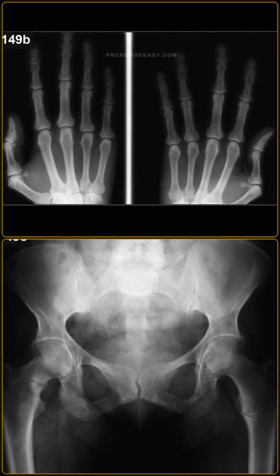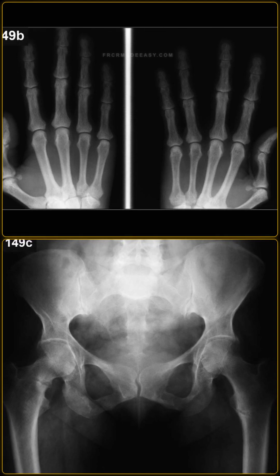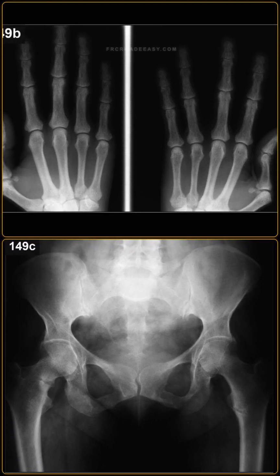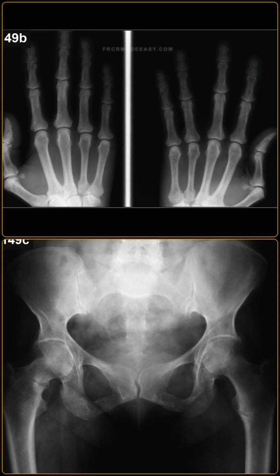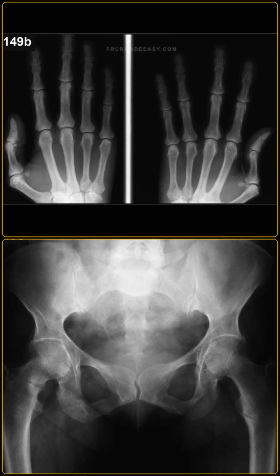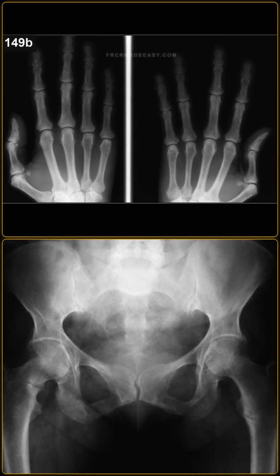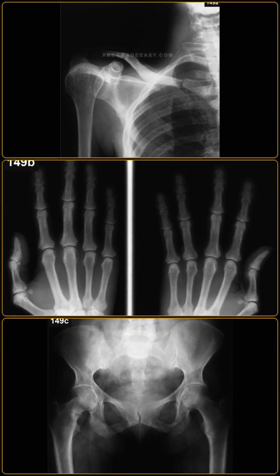line on chest radiographs. Additionally, we may see resorption of the lateral clavicles, prominent vascular or soft tissue calcification, and brown tumors, which appear as lytic bone lesions. The differential diagnosis for generalized osteopenia includes osteoporosis and hyperparathyroidism. How would you manage this patient as a radiologist?